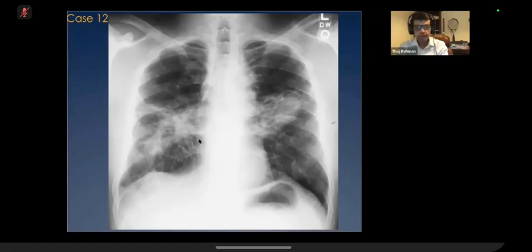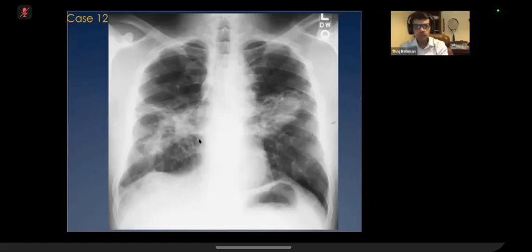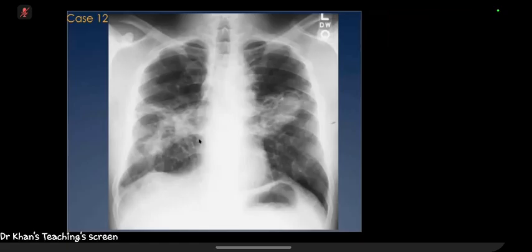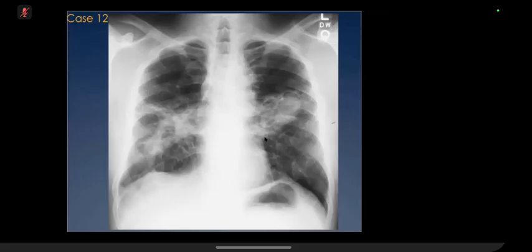Yeah, you're right. Go ahead. So background scarring of the lung. Now these two bilateral hyperdense lesions. Initially, I thought about progressive massive fibrosis. That's a good thinking, because perihilar large consolidation is the appearance of progressive massive fibrosis. But progressive massive fibrosis is usually a bit more upper to mid zone. That's good thinking. Go ahead.